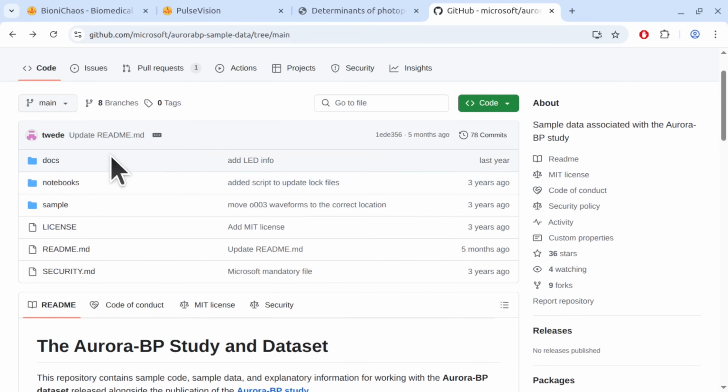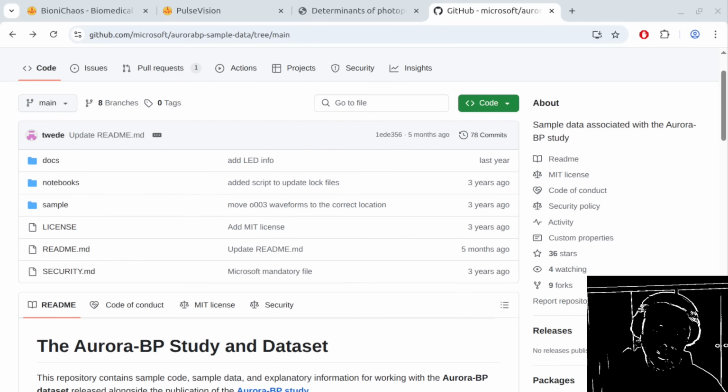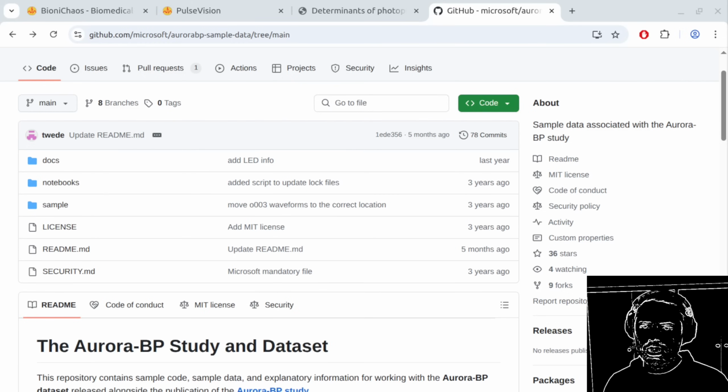Yeah, we don't care for the notebooks, the docs, whatever. Well, because if we just grab the data, we can make our own thing out of it. So like independently checking it instead of relying on the existing code. That is another 800 lines of code sample, which is a nice visualization. Let's do a NotebookLM review on the code and just show the visualization. How does that sound? A critical and detailed review, avoid jargon, use plain language.